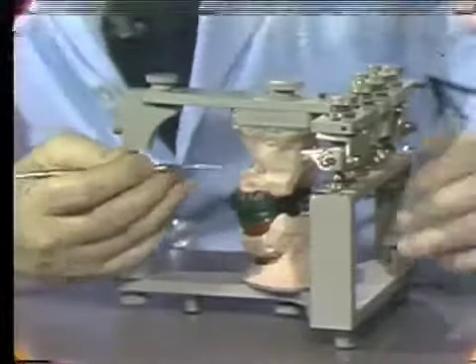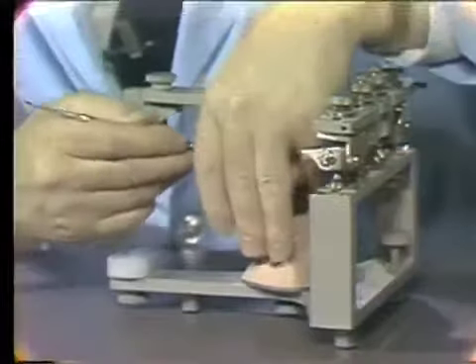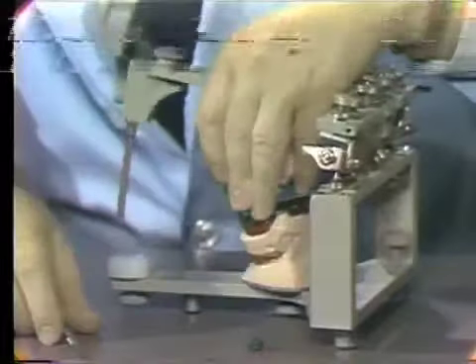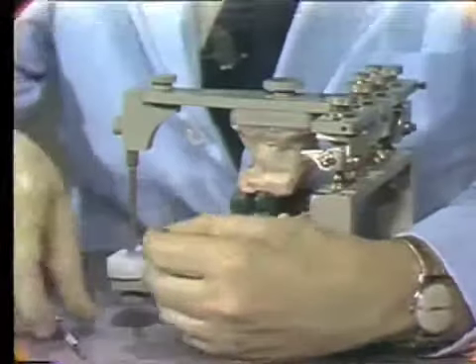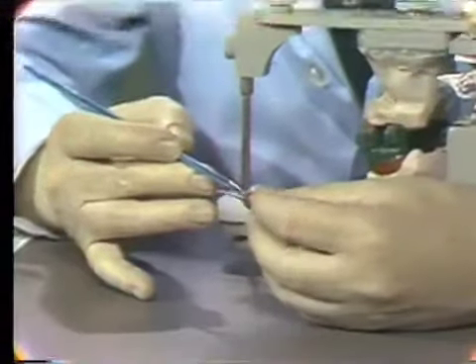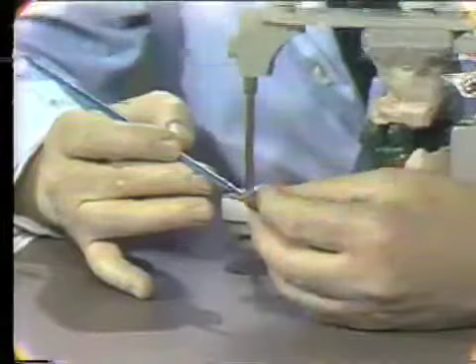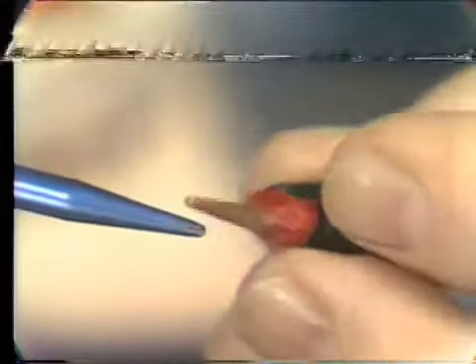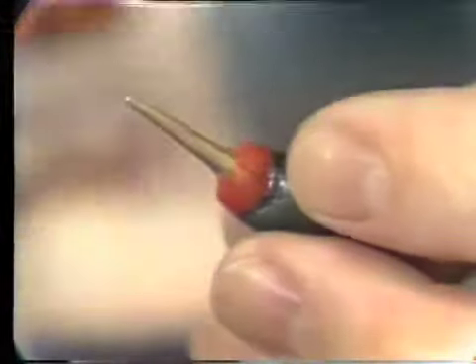Also, it's well to take all of the dies out of the model, make sure that there is no wax between the base of the die and the stone. The die can be elevated out of the socket by flakes of wax that collect on the base of the die or the dowel pin. Make sure that this wax is all removed and you have a good accurate seat of the die back into the working model.